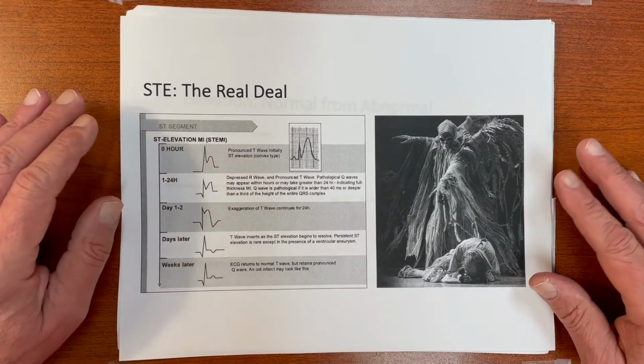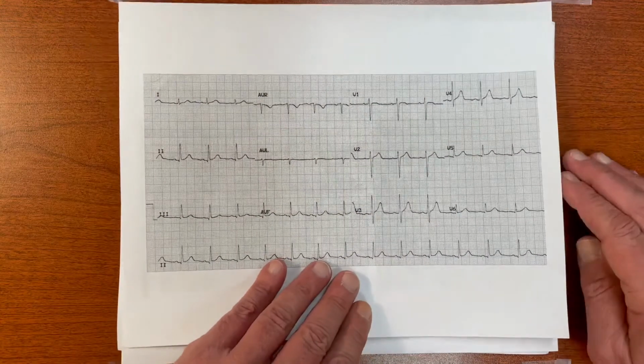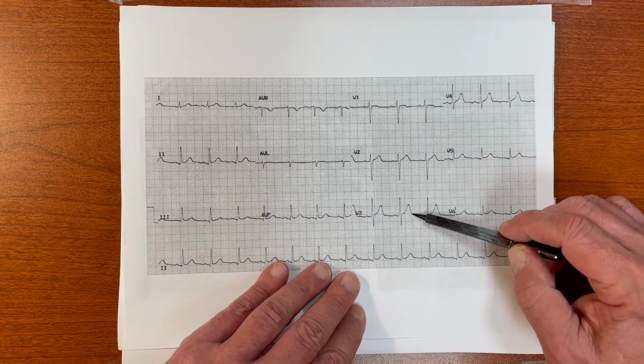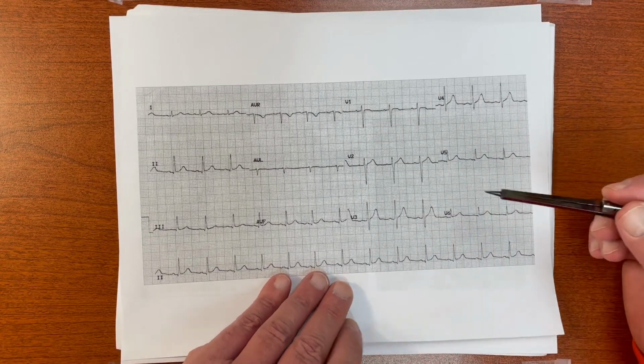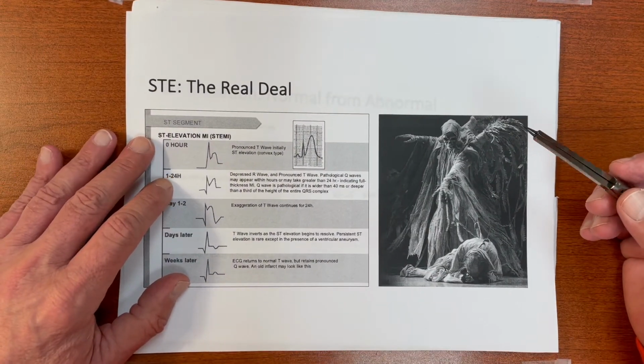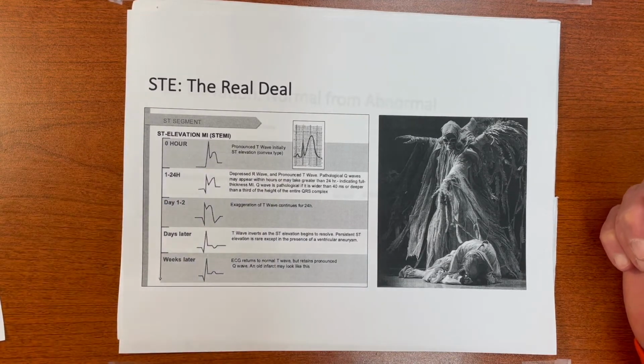Okay, so with ST segment elevation, it can be normal, as we saw on a 12-lead EKG. It was very mild, remember, just in the septal leads. Okay, it can be a STEMI, okay, abnormal. It can be another benign normal variant, different from a normal EKG, nevertheless benign in diagnosis, and then another one that is a pathologic diagnosis.